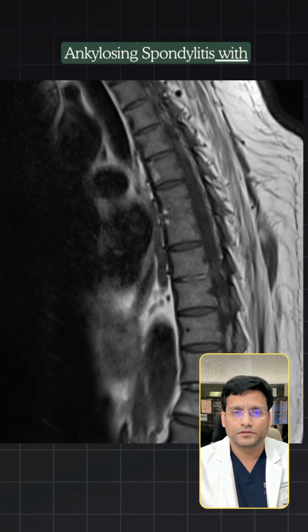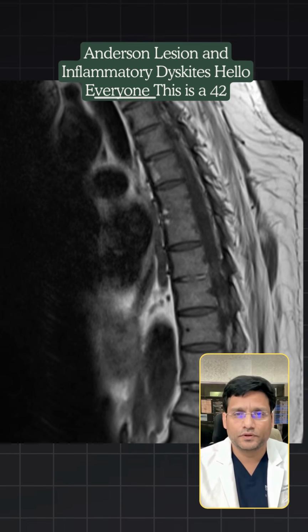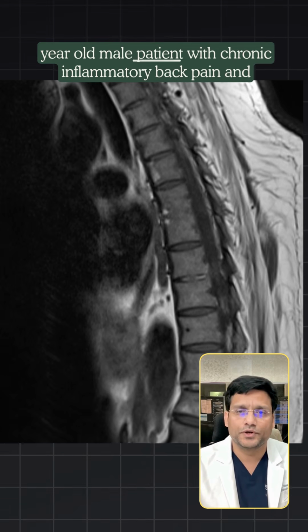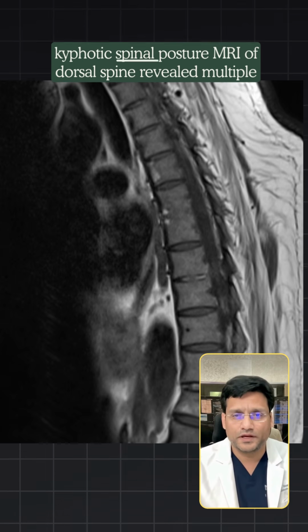Ankylosing spondylitis with Anderson lesion and inflammatory discitis. Hello everyone. This is a 42-year-old male patient with chronic inflammatory back pain and kyphotic spinal posture.